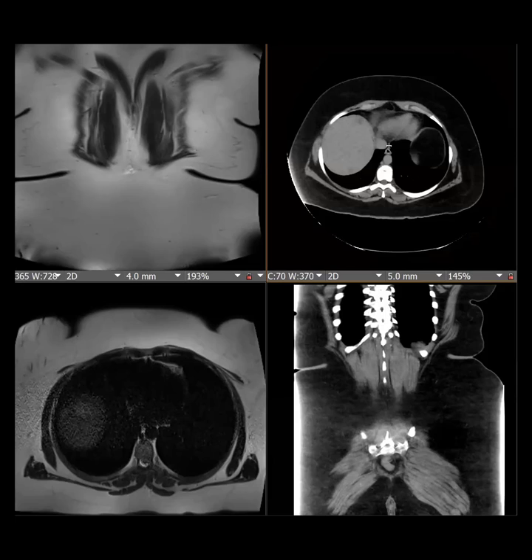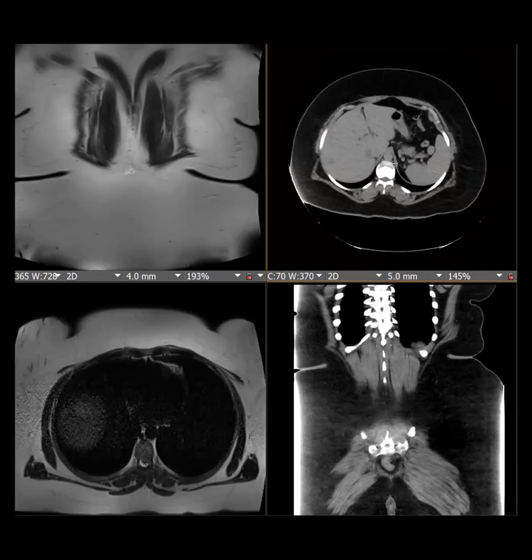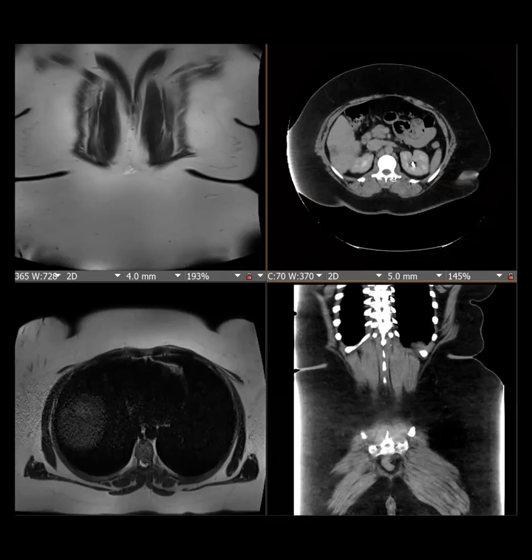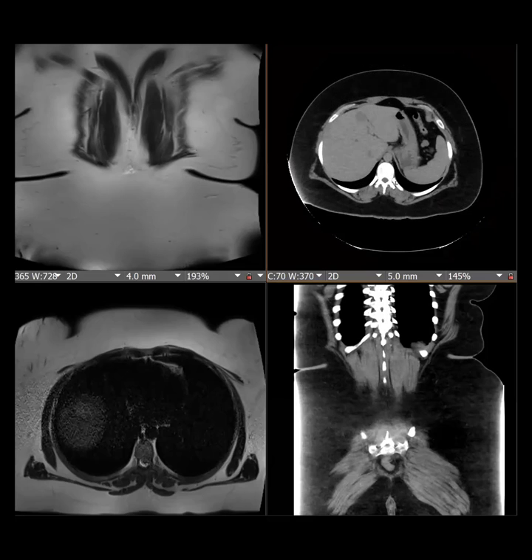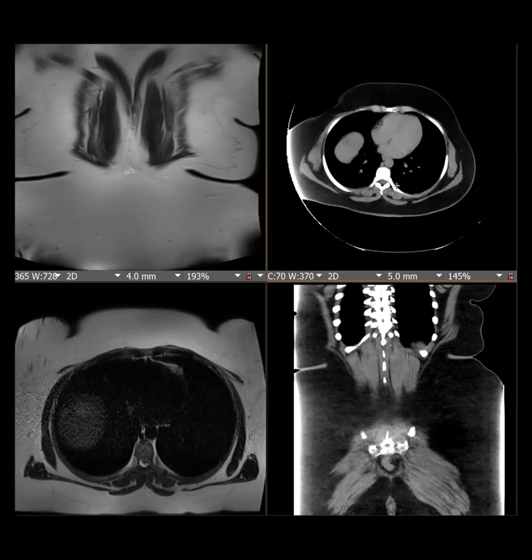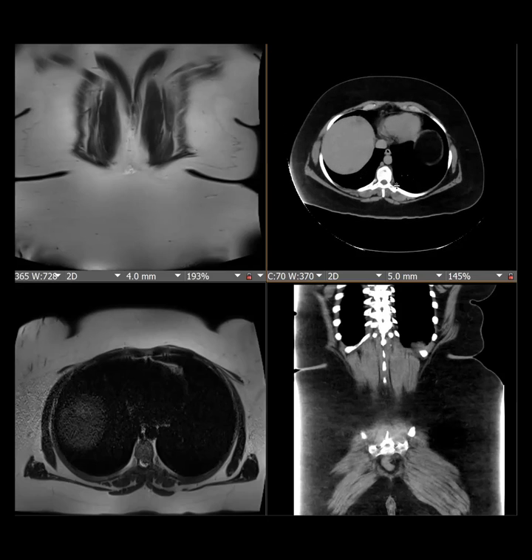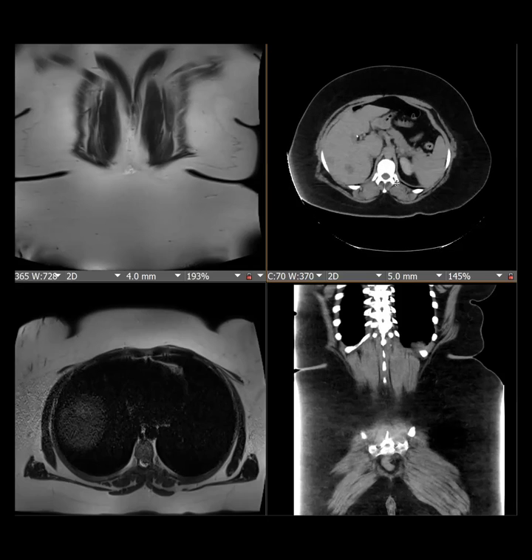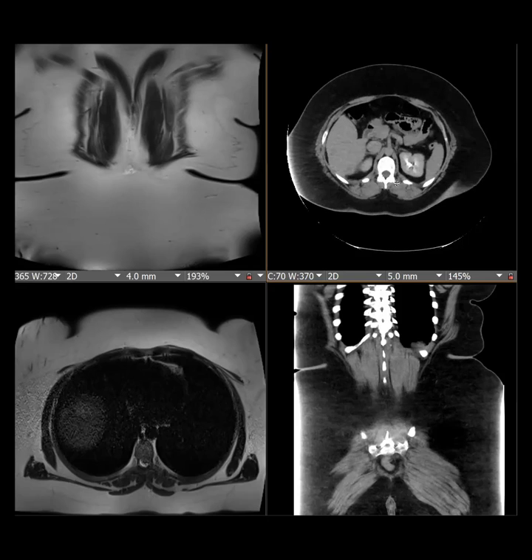So I'm going to show a CT, then I'm going to follow with an MRI. This was a CT that was read at an outside hospital on a young patient. Everybody can see that she had a cholecystectomy, but she has these hypodense lesions in the liver. These were misinterpreted at the outside institution as intrahepatic cysts. Then she came to us in the interval between this examination and the MRI that was performed.